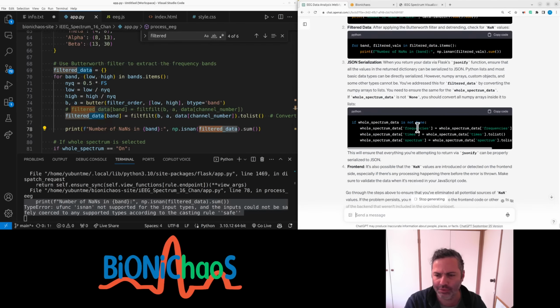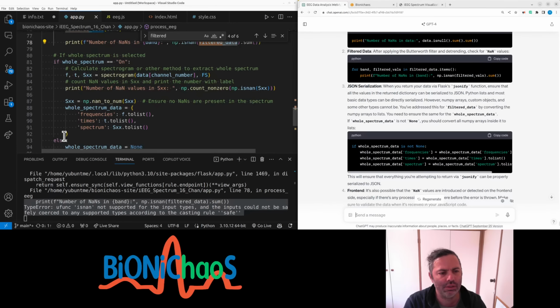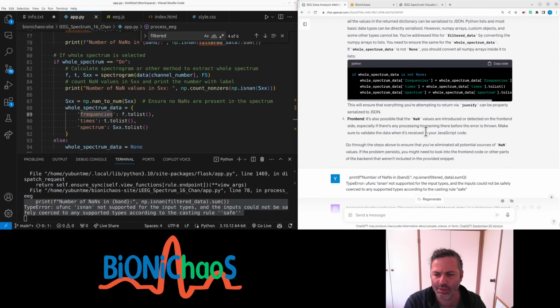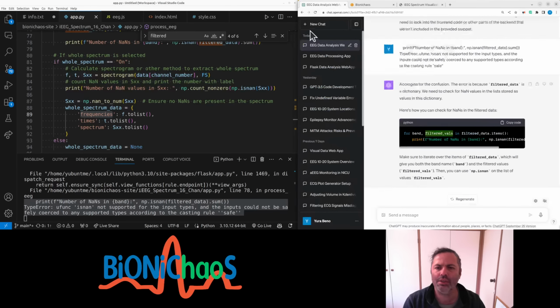Well, first we're having this error, but also whole spectrum is not none. Yeah, I'm converting this to list already. Frequencies times spectrum, yes, front end. I don't actually have that line. Okay, let's start a new chat.